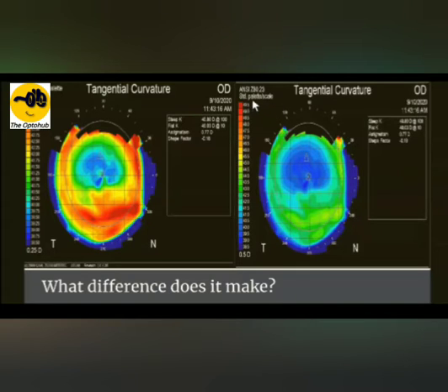So over here, it's a standard scale. Okay, and over here, what you're seeing is 38.5. That is fair enough. But if you see, the steepest region is 49.50. So now what it is doing is it is magnifying all your flatter regions, but it is unable to show you the warm colors of the steep regions. If you just look at this pattern, nobody would say that there is a little bit of steep region over here, whereas on the left side on the auto scale you understand that there are subtle steep regions as well.